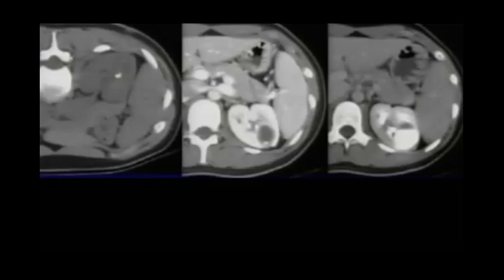So this calyceal diverticulum with stones has different shapes. In the IVP, you can see this one, and you can see the dilatation of calyces surrounding the stone. Even in practice, you will see it much. So this is what is called calyceal diverticulum with stones.